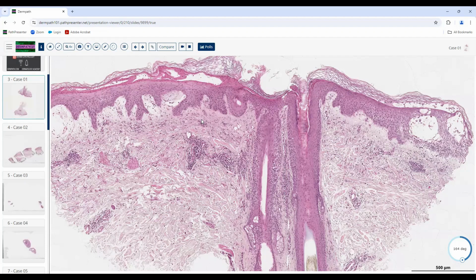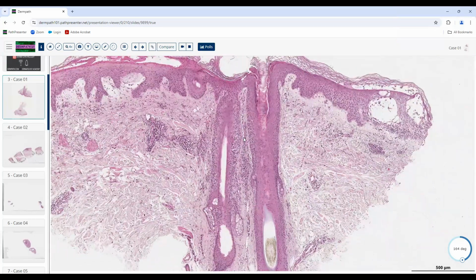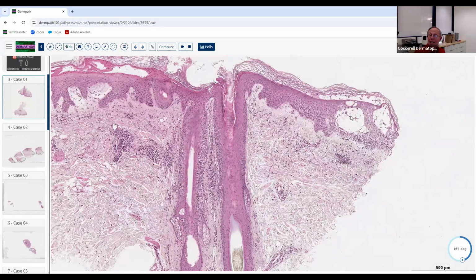I think things that would be less likely to be acute, but still somewhat in the same bucket, would be stasis derm or seb derm, and tinea. Yeah, so you've got all the different things in there that can cause spongiosis. That's a good general list, but if you really want to hone it down, we should ask ourselves how many of those diseases actually give you spongiotic microvesicles, where you actually get blisters. Not too terribly many.